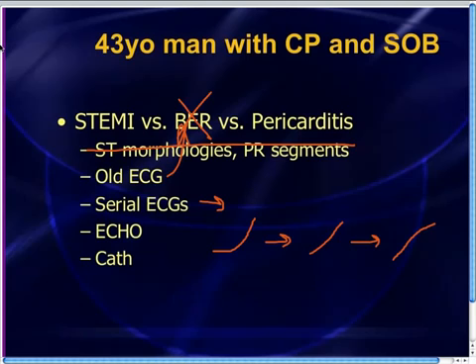Maybe those ST segments are starting to drop. Maybe you're starting to get some reciprocal ST changes. That also tells you that you're looking at a STEMI.